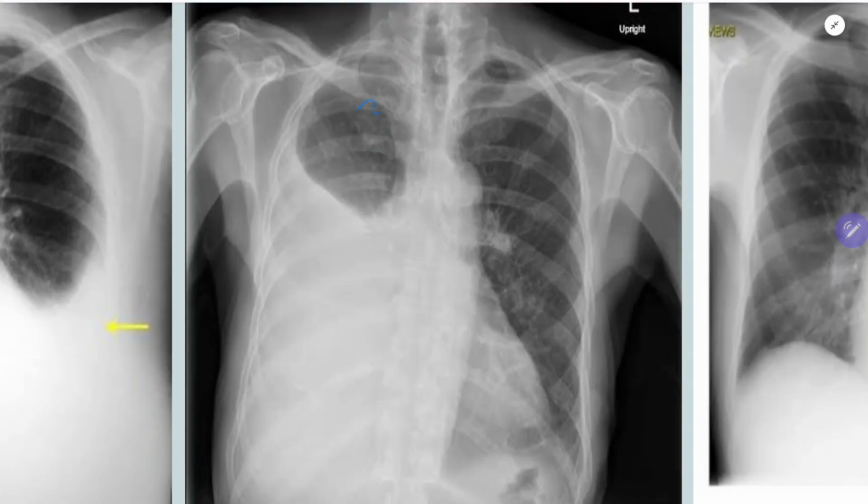Okay, you just see this chest X-ray now. So this chest X-ray shows a large effusion. That was moderate. This is a large effusion. This is the fundus, gas in the fundus region of the stomach. So this is a chest X-ray of large pleural effusion with compensatory hyperinflation of the other lung and the upper part of this lung. There is compensatory hyperinflation of these lungs.